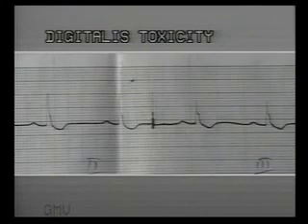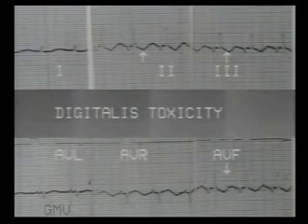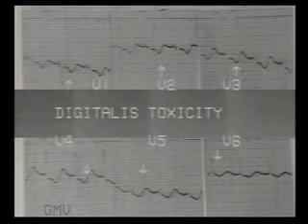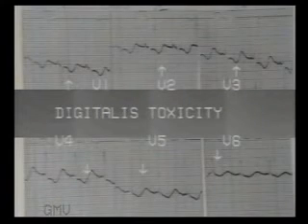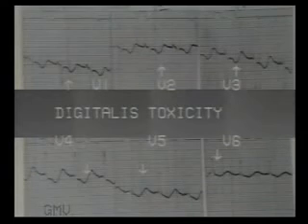In this ECG once again, the characteristic ST segment depression of digitalis toxicity is seen. With further toxicity, the T wave becomes flat or inverted and various cardiac arrhythmias may appear, commonest being ventricular extrasystoles, ventricular bigeminy progressing to ventricular tachycardia. Also remember that the ST depressions of digitalis toxicity are seen in many leads, anterior as well as posterior and chest leads.